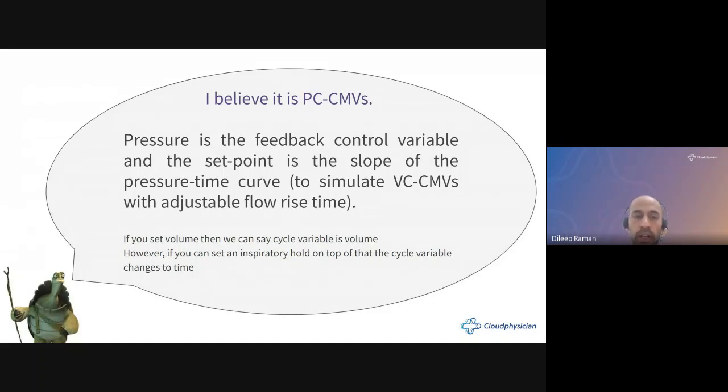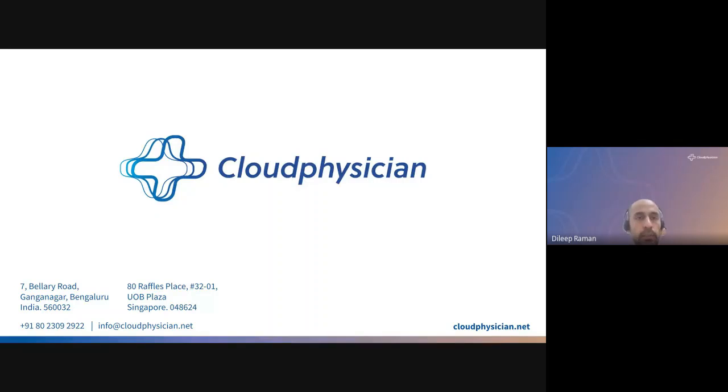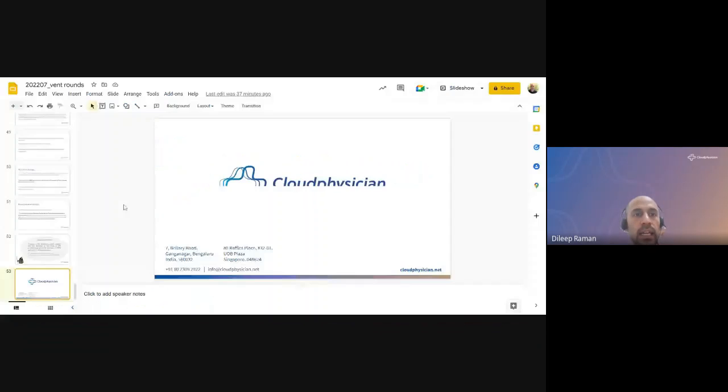So what are the potential problems here? The potential problems here are that you could misinterpret the mode, and we'll go back to some of the parts that we were talking about on the waveform. Let me share that slide again, and you can think of questions, because this is one of the more complex waveforms you will see. Yeah, Rolly, go ahead.